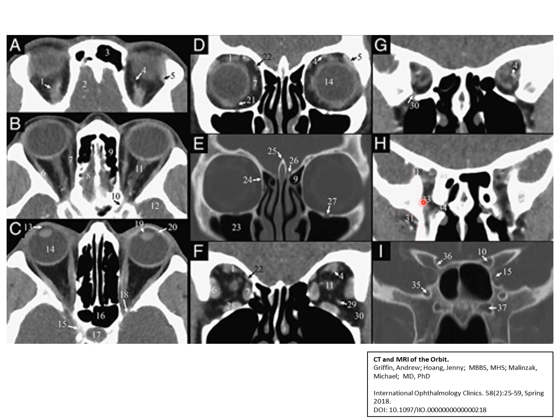and sphenopalatine foramen. This last image is through the level of the optic canal, and it shows the foramen rotundum. This is the foramen rotundum, and this is the optic canal. The floor is formed by the optic strut. These two are the optic canals, and then we have the Vidian canal. Cavernous sinus is seen here on both sides, labeled as item number 15.